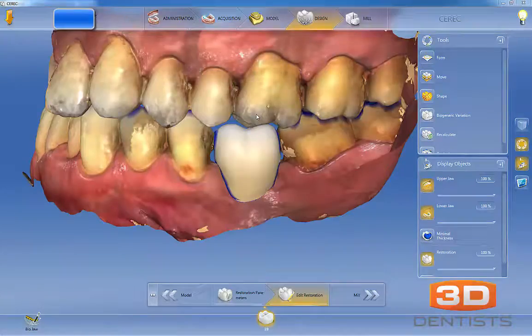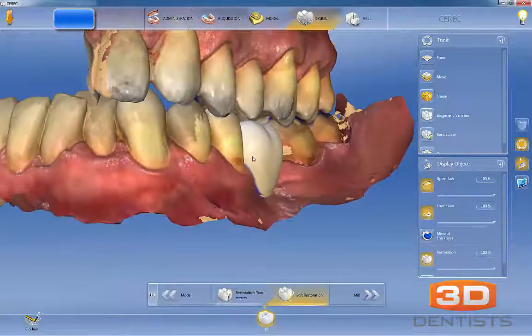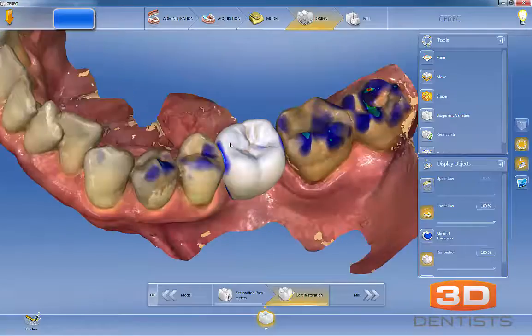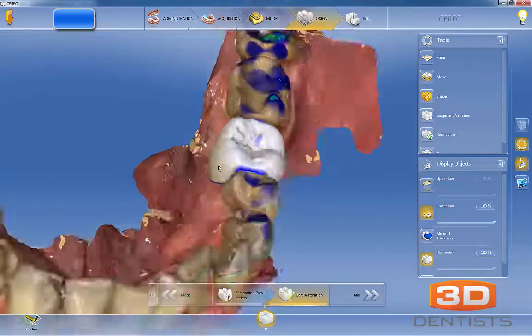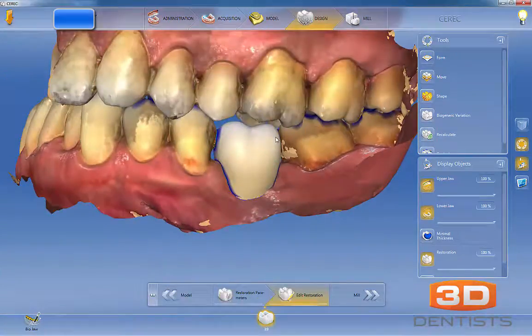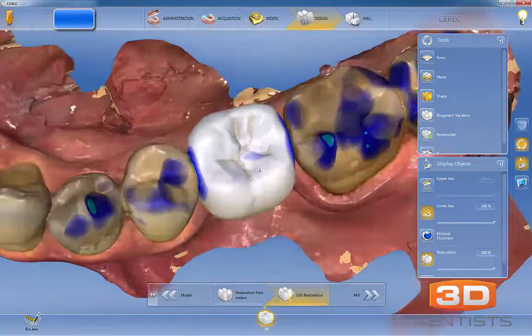Alright, I want to take the opportunity to go through a very common mistake we see when creating SSI files. Here you can see this patient is missing tooth number 19, and we're going to be placing an implant there. Part of the concept is always restoratively driven implantology. In other words, we will take an upper jaw, lower jaw, and a bite, so that now we can actually design our restoration and have it ready in ideal occlusion.